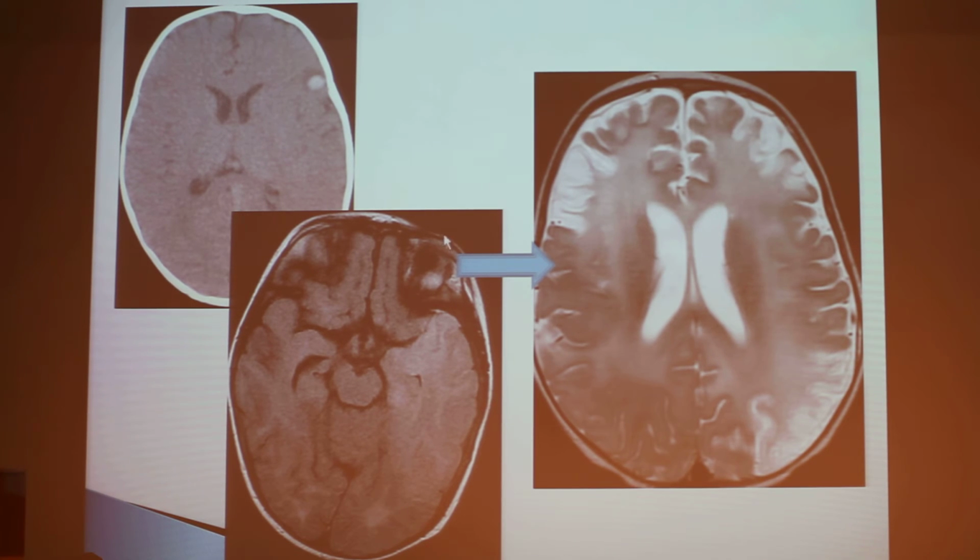But on MRI, a day later, we see the significant edema in the anterior temporal lobe, and the combination of hemorrhage and temporal lobe disease with edema makes the possibility of herpes encephalitis very likely, and even with appropriate treatment, we see significant damage later on.